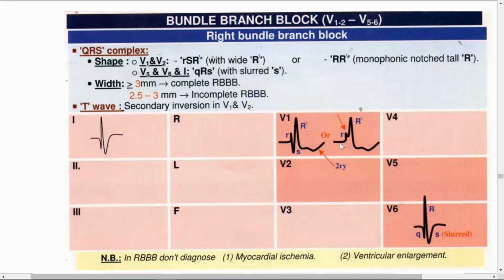So this is R dash, there is no S. This is an R wave positive, then there is a negative deflection, and R dash, and this complex is wide. So this is RSR dash.